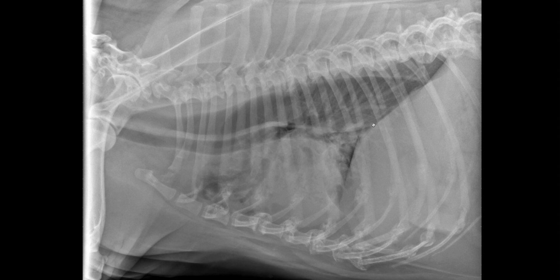And you can see also here the ventral border of the esophagus. So all this esophagus here is dilated with gas. You can see also it's displacing a bit the trachea ventrally. So this is a megaesophagus. We'll go back to that in the conclusions.